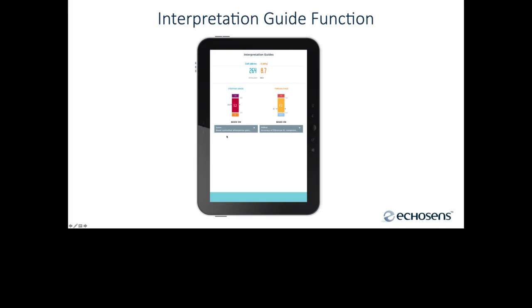Then you'll notice that whoever did this picked Sasso et al. as their CAP reference publication, and they picked Afdal et al. as their VCTE reference publication. So based on the values of this patient and the thresholds within those publications that were selected, this graphic is produced.